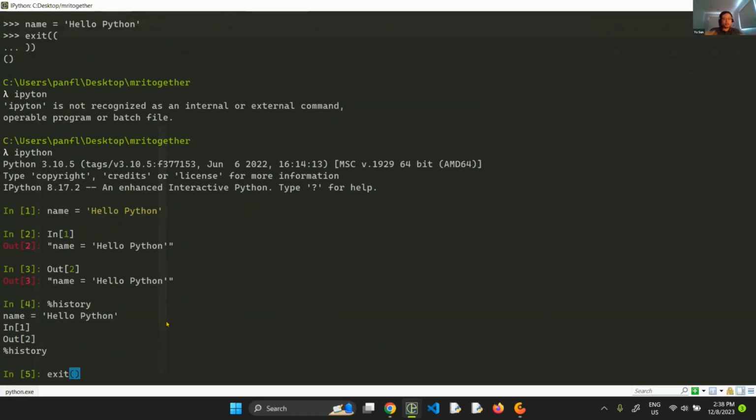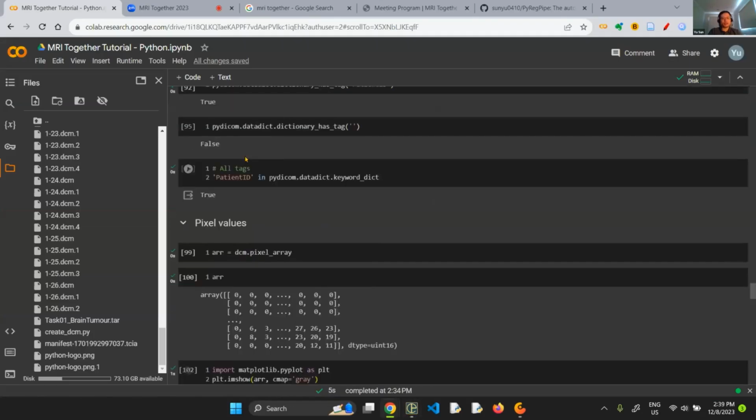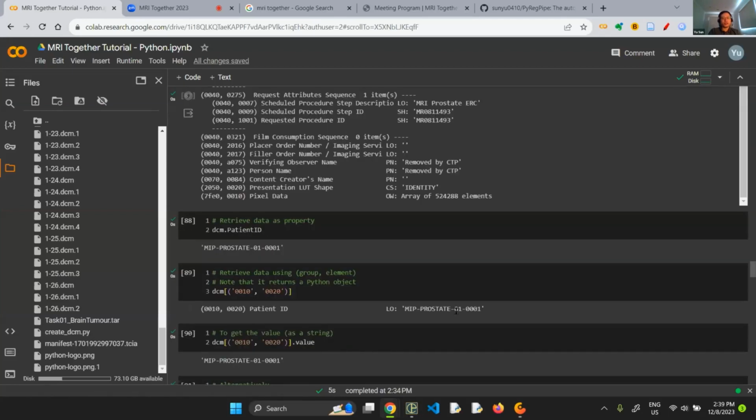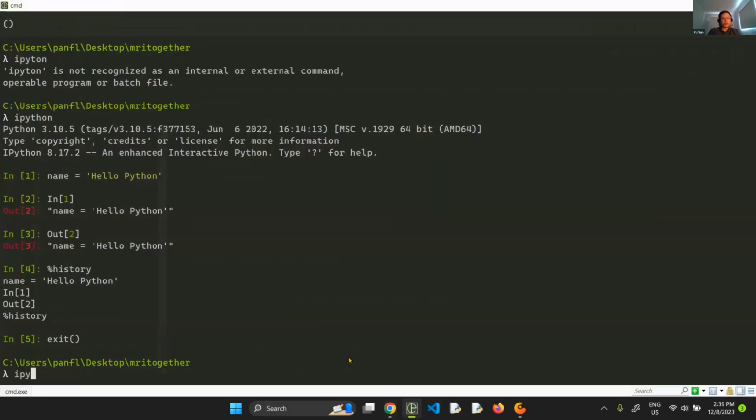Okay, and people said, this is not enough. We need to have documentation and this output all merged together as one document, so that you can write the process more simply, like what I've done here, some bit of explanation and then the code, and then we can execute it and get the output. And at the end, you can get everything as one page and share it with other people. That's how people came up with the IPython Notebook.